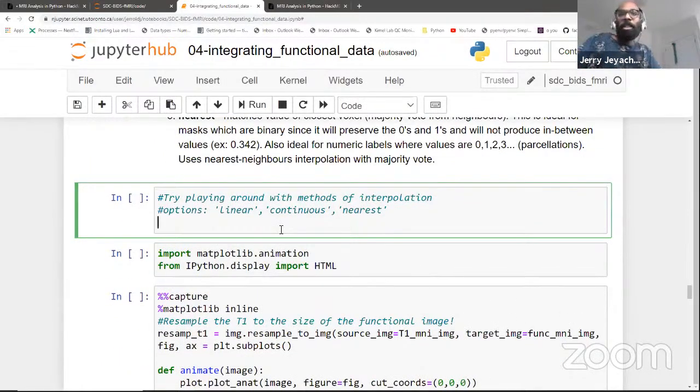And over here, we're going to just do one resampling interpolation, and nilearn does all of this hard work for you. So I'm going to make an object called resamp_t1, and we're going to do image.resample_to_img. The affine matrix does change. The only thing that changes in the affine matrix is the diagonal of the first 3 columns. And that diagonal represents how much you have to scale a voxel by, right? So when you shrink down an image, those 3 numbers in the diagonal will change, which means your voxels are different sizes.